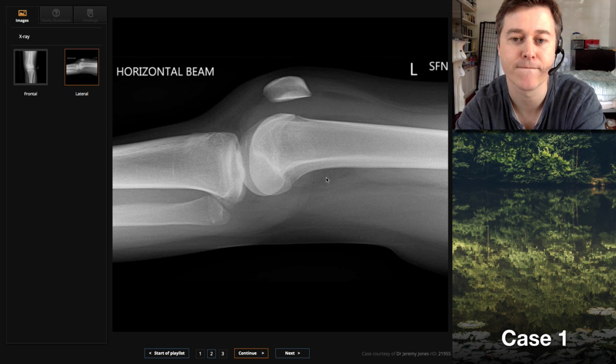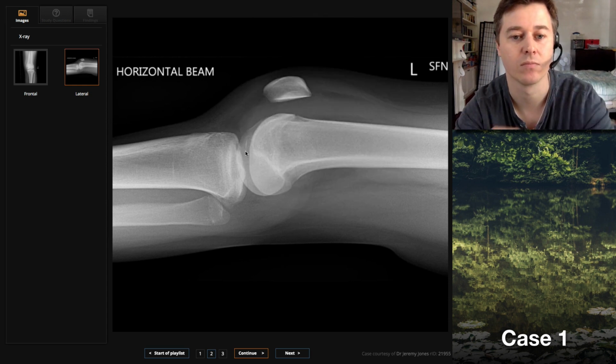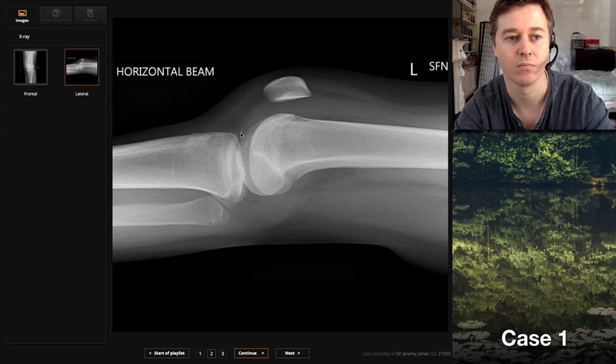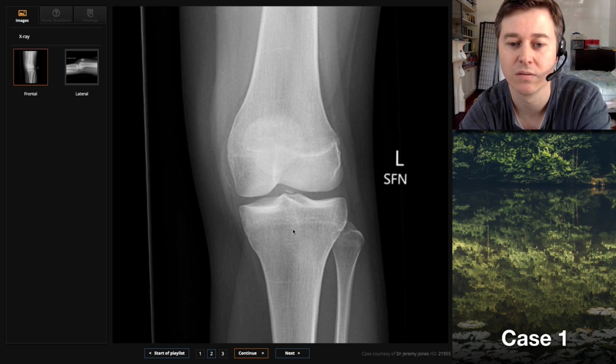So on the lateral projection, there is a large hemarthrosis. Yep. And the linear osseous fragment over the intercondylar region is again seen. So this is highly suspicious for an acute fracture. And what do you think it could have come from? Yep. The donor site is a little difficult to appreciate. It could be like the intercondylar eminence. I think I'd like some cross-sectional imaging, though, to review this further.